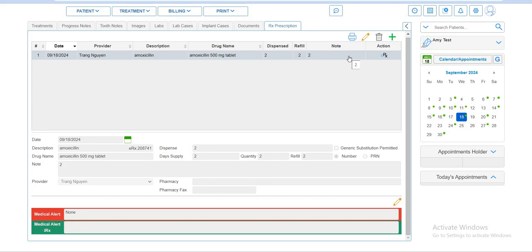So this one is for the doctor. We have been talking about the clinical part, what the doctor needs to know, right? Yeah, this is all what the doctors need to know about the software. Good. Okay. So now we can move on to a different subject. Okay. Yeah, I want to end this recording, and then I'll start recording for the staff, the DA in the clinical area, what they need to know.